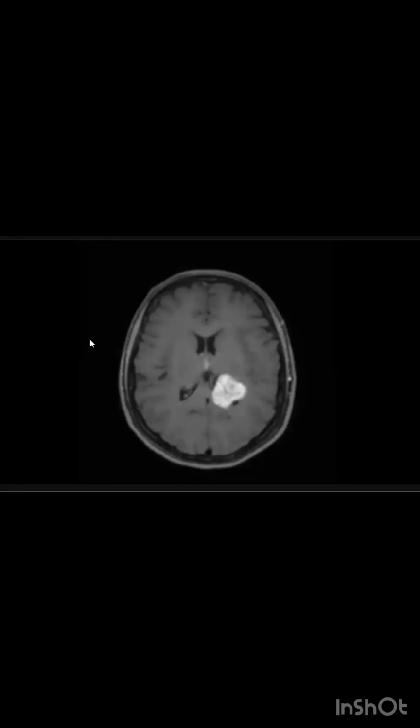You put choroid plexus papilloma or carcinoma. What is against this diagnosis, please? Because the lesion is low signal in T2, with heterogeneous low signal inside the lesion, which may be flow voids. How will you confirm your diagnosis? Can I check the post-contrast imaging? Here is the post contrast.